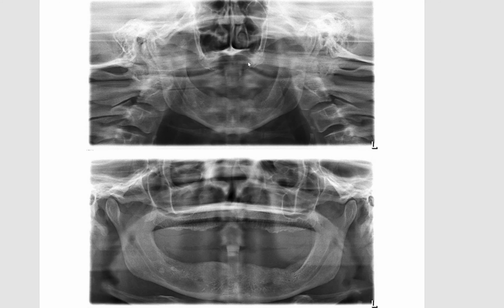So that's why this patient was biting too far forward. You bring the patient back a little bit, and now you have a much better image. So that was the main point of this exercise, or this radiographic example.